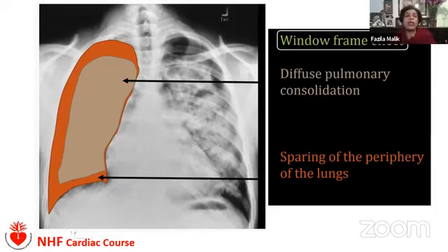And so one important thing about X-rays is that we really need to correlate these with our patient, right? And in our day-to-day clinical practice, correlating an X-ray with our patient's history and other findings is very easy. In a way, during examination, it's a bit unfair because we're just being given an X-ray and we're expected to know what the diagnosis is. But if we see something like this, this could be a clue.